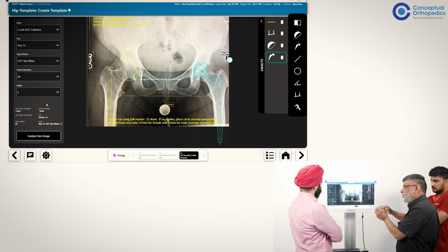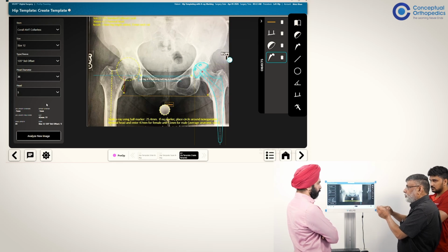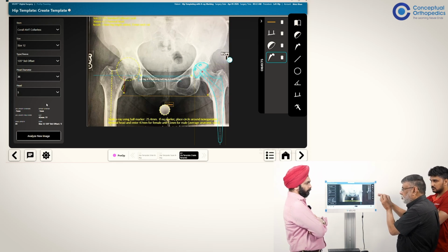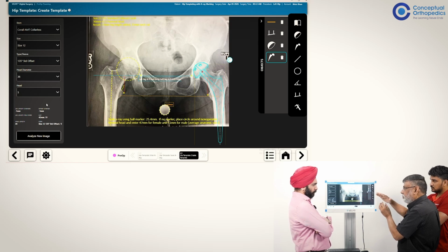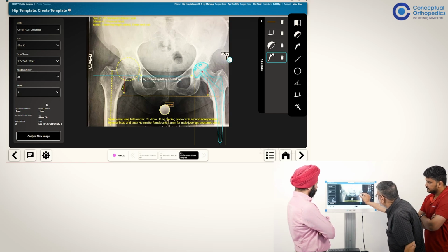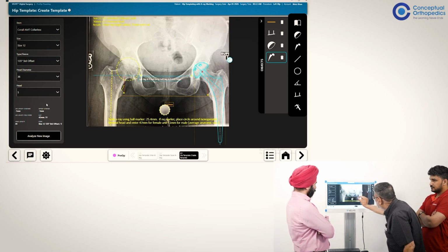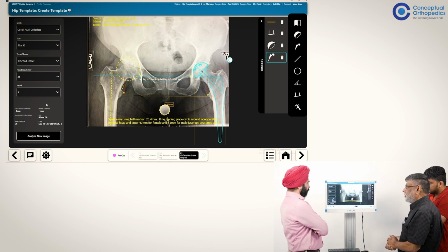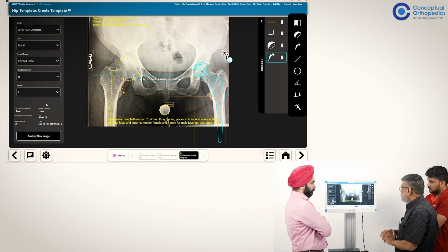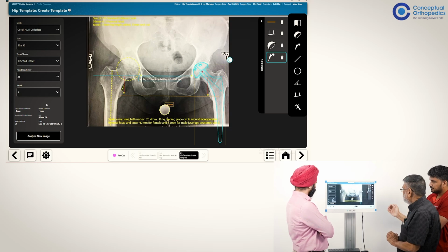So you do a dual adjustment and you get offset. But better, if you just want offset, is to shift the whole trunnion medially. So don't change the angle, remain parallel, but shift this neck from here on this base. That increases mainly the offset. That is the high offset option. So let's see what happens.